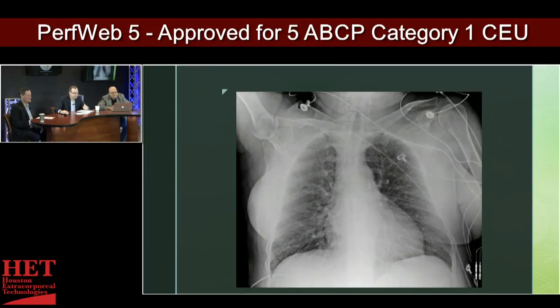But you know, I think this is good technique. I think this is a good exposure, meaning you see all the structures appropriately. And I think the orientation of the patient is very good. The diaphragms are nice and even. The lung fields are fairly symmetric. You see that the trachea is essentially midline down the center of the spine. It's not rotated. The other things you could look at are the heads of the clavicle, and then also over here in the humerus and the scapula, how those things can look a little bit different if it's rotated. So those are all the things that I look at, and so I can safely say that this balloon pump is in an appropriate position, and this is a good quality x-ray.